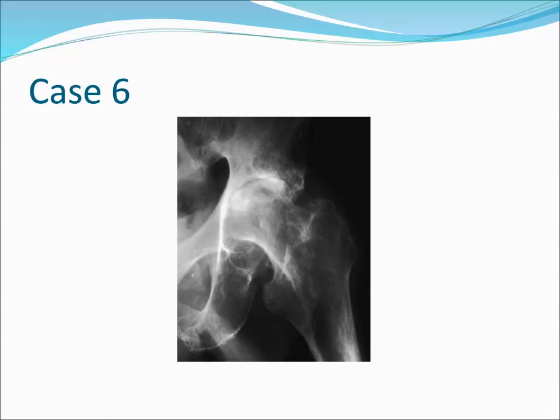Note the severe joint space narrowing in this patient with rheumatoid arthritis. The femoral head has migrated in an axial direction with fairly concentric joint space narrowing. Minimal secondary degenerative changes have occurred, as noted by the sclerosis in the superior portion of the joint. However, these have been diminished somewhat by the osteoporosis that usually accompanies rheumatoid arthritis.